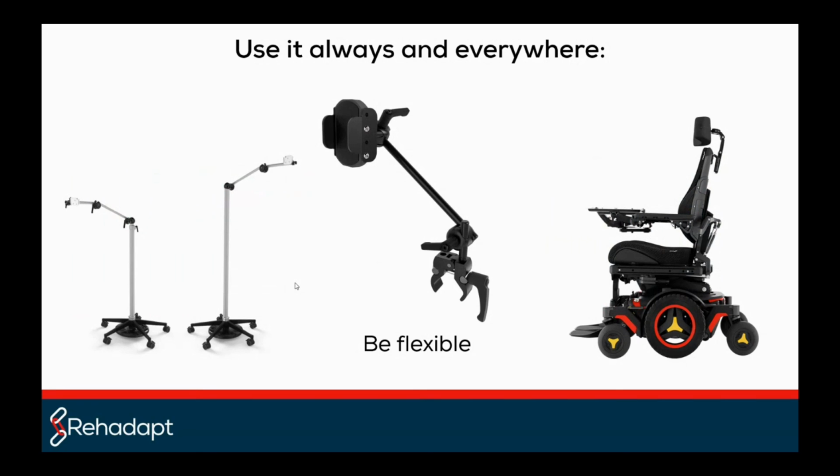Also, when you want to use it just on a table mount, such as this foldable table mount, can be an option, because you can use it in combination with a protective cover, insert it, and position it on the table at each angle where it is important for the beneficiary.